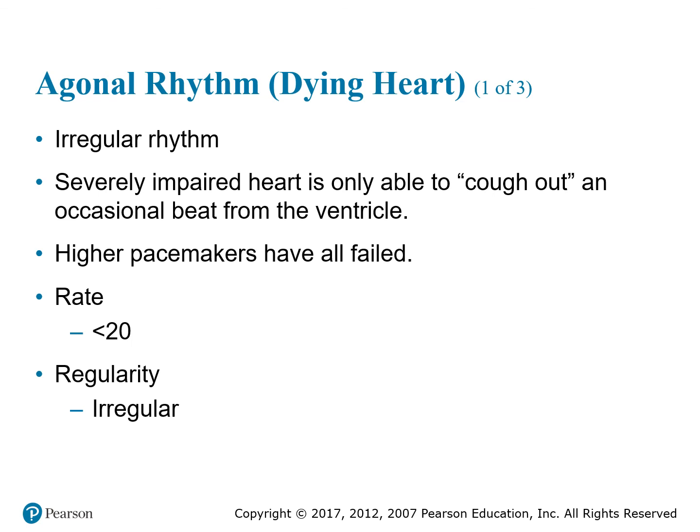The next rhythm we'll talk about is the agonal rhythm, or sometimes we call it the dying heart. Agonal rhythms occur when essentially all of the pacemakers in the heart have failed. This is the last electrical activity in the heart. The heart is basically dying. This is like its last little leg that the heart is going on before it just gives up and stops contracting.